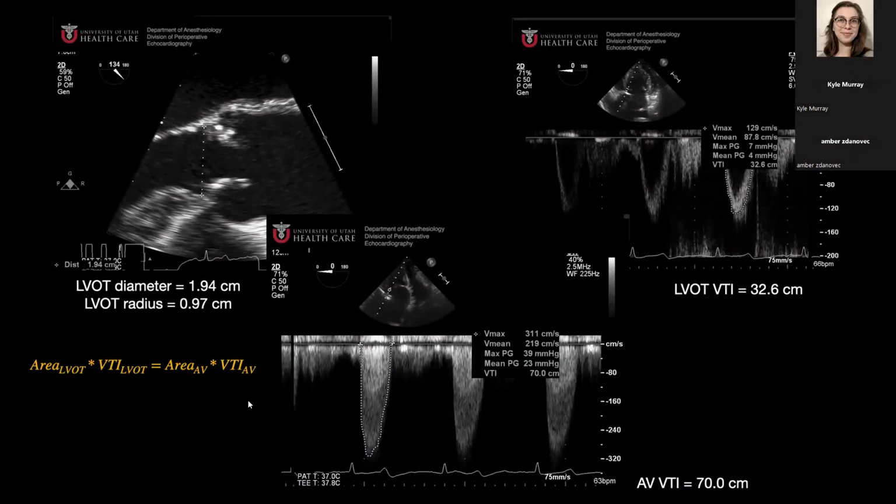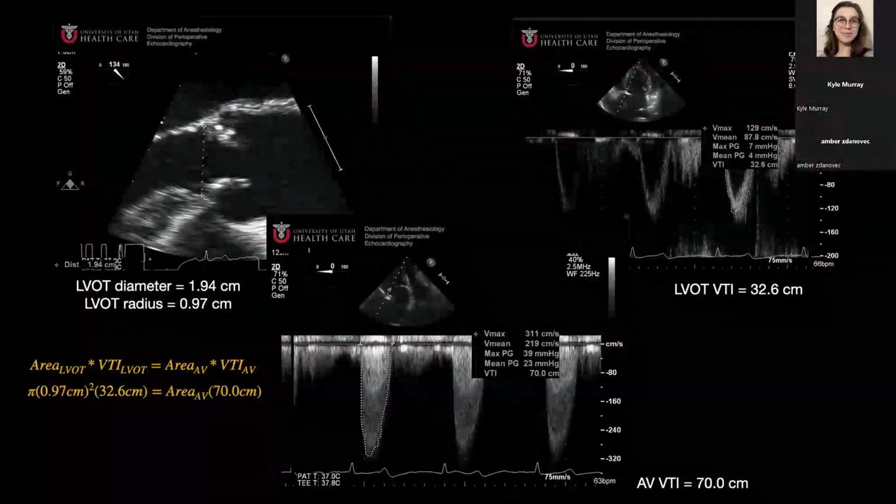So the computer does that for you, but that's the area. So it takes the area under the curve, it integrates it, and you get a distance. Okay, all right, so we're gonna fill in the gaps.